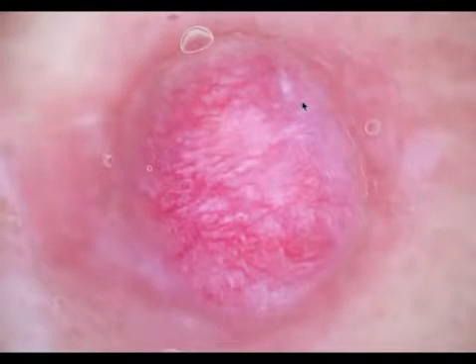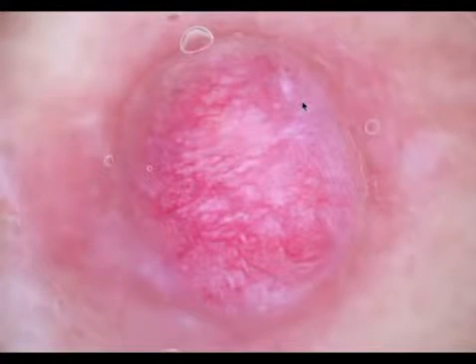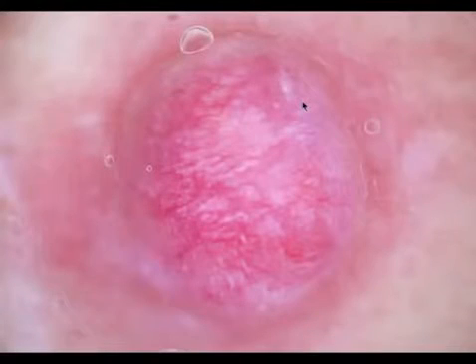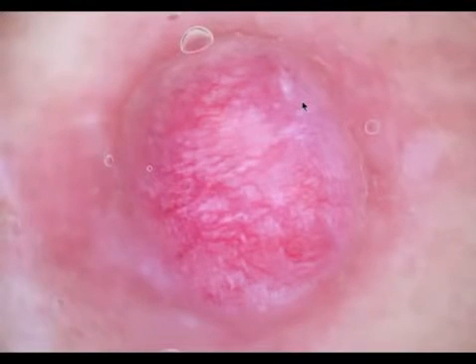Again, basal cell carcinoma, but take care, because not every lesion with serpentine branched vessels is a basal cell carcinoma. This is a malignant peripheral nerve sheath tumor. And whenever you have a nodular lesion where the vessels are arranged in a non-specific pattern, or where the vessels are arranged in a way that they are branching, then you have to excise it.